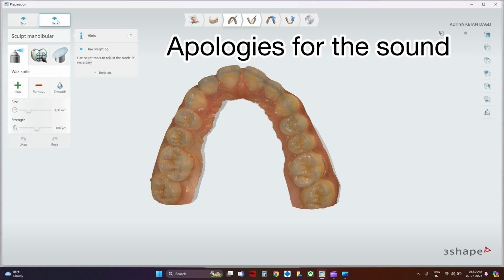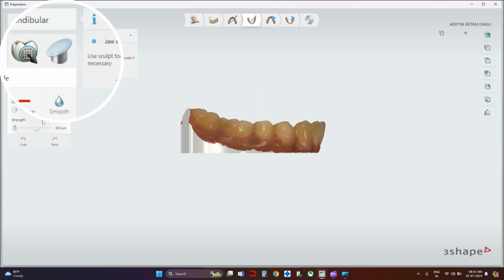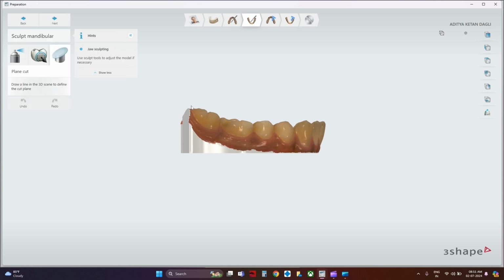So it's okay if a small part of your 7 is sacrificed for this, because it is going to make your 3D printing process extremely predictable and fast, and you can achieve not only the same but much more superior retention from adding attachments and using the other embrasures of the natural teeth.